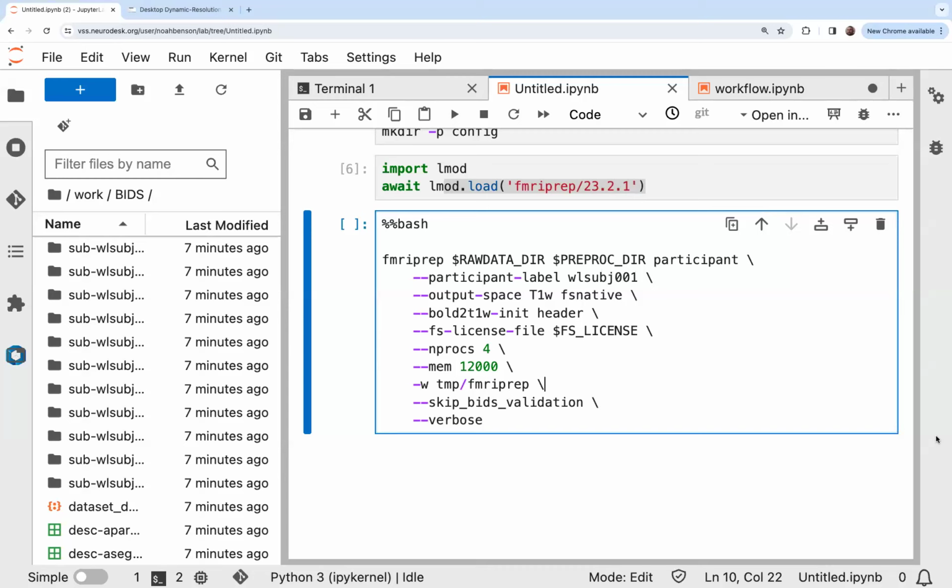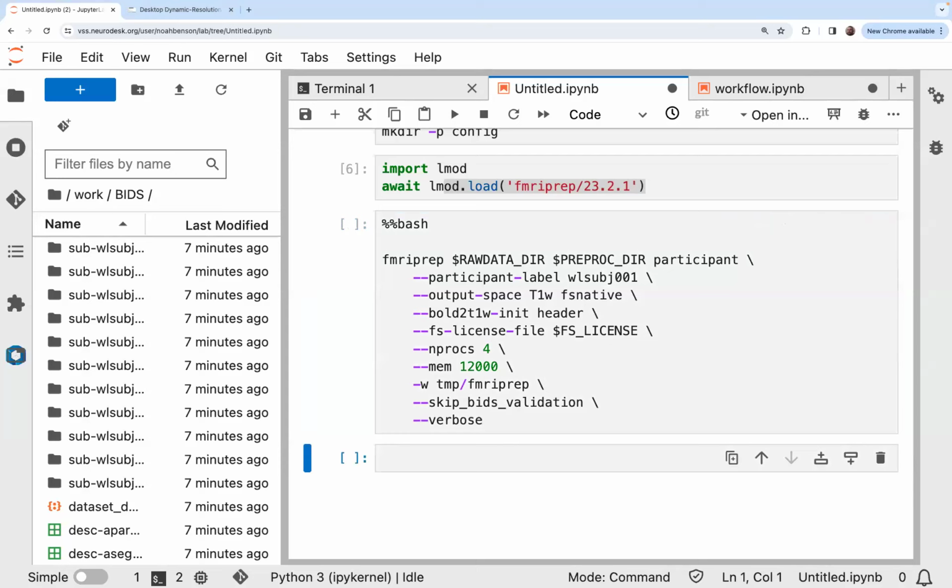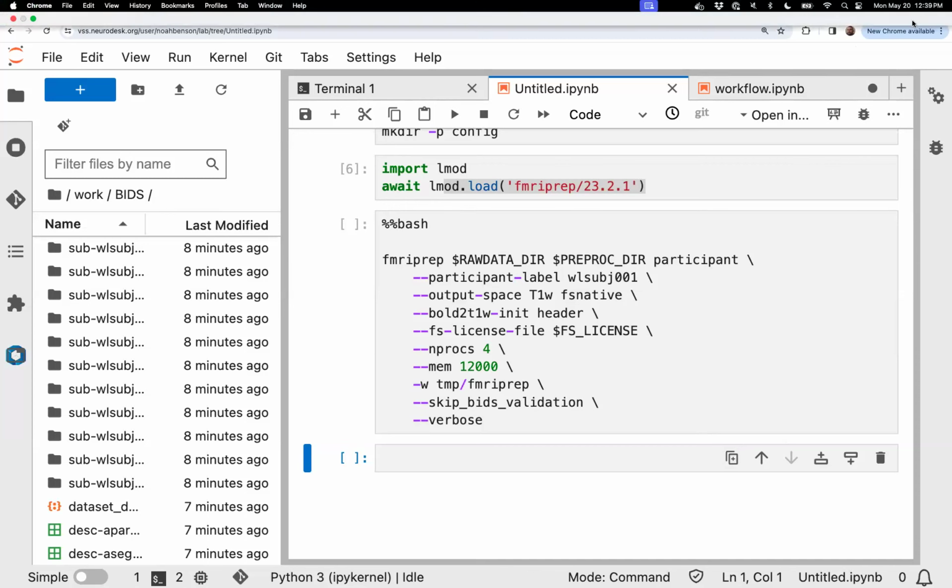Okay, so there are a lot of tools that will solve population receptive field models. Examples are AFNI, which has a tool for this, a Python tool called Popeye, VistaSoft, and Analyze PRF. There are quite a few of these. They're pretty much all open source, or most of them are anyway. But one problem I think with them is that none of them are really Dockerized to work anywhere. They're all things you have to install. But there is a Dockerized version of these tools called PRF model. And what we're going to do now is set up the PRF model Docker to solve these.